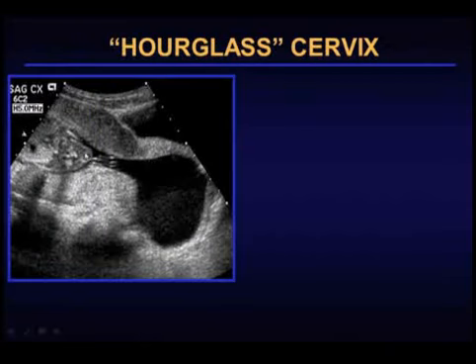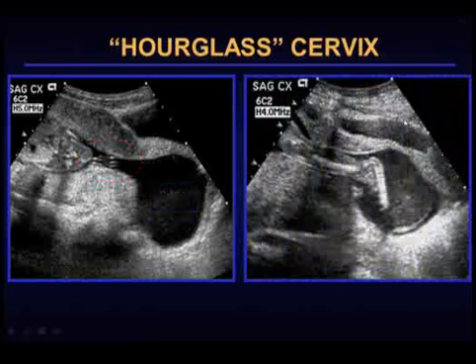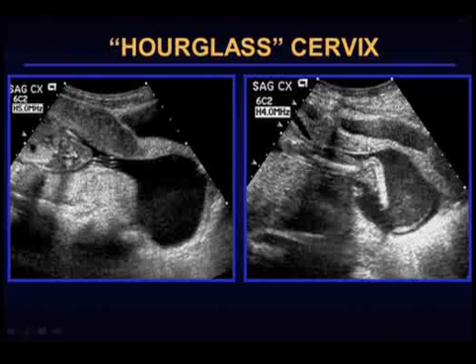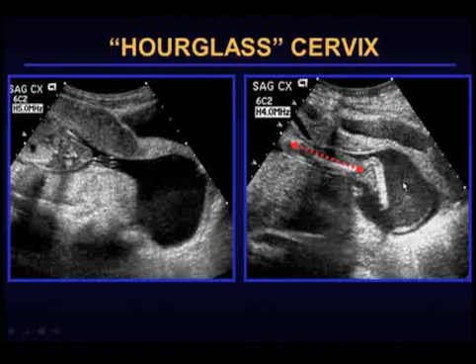Here's another example. And again, notice how this endocervical canal, which is completely dilated, is not that distended. The diameter is not that great because so much fluid is present in the vagina, which can accommodate this large amount of fluid. Notice also in this case, what's coming into the endocervical canal is the umbilical cord. So that's a really bad situation when you have a cord presentation. And here's another one. Not that dilated, but accommodating a lower extremity and the foot, which is sitting in the vagina. And here are the membranes, again, that you can see herniating into the vagina, containing echogenic fluid. That's not uncommon late in pregnancy.